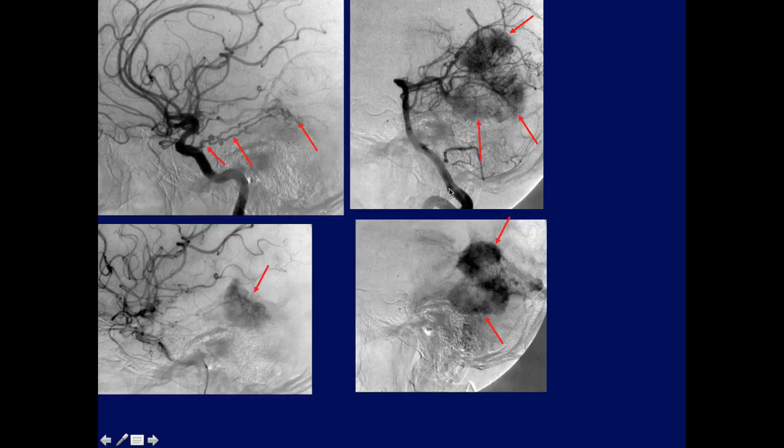And then on the injection of the vertebral artery, we see the posterior cerebral circulation and a different segment, the more peripheral segment of the tumor is supplied by posterior cerebral artery branches. So all these voids may be being supplied by the meningohypophyseal or the tentorial artery.